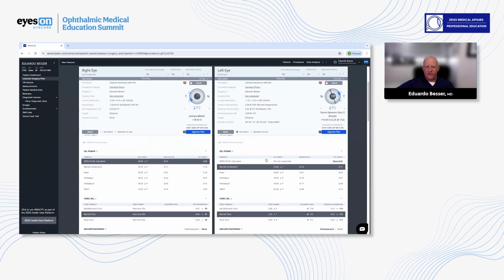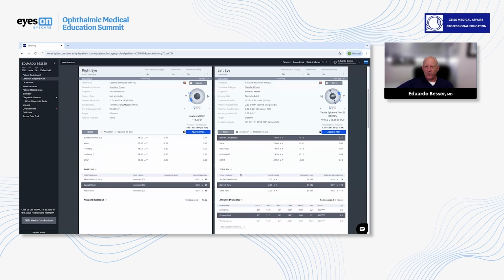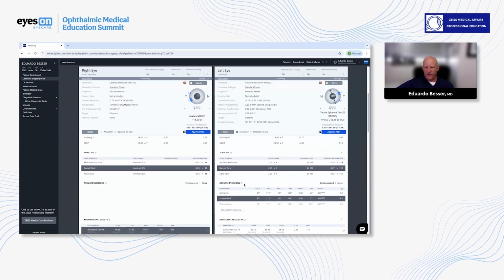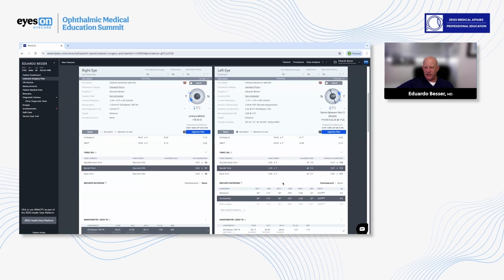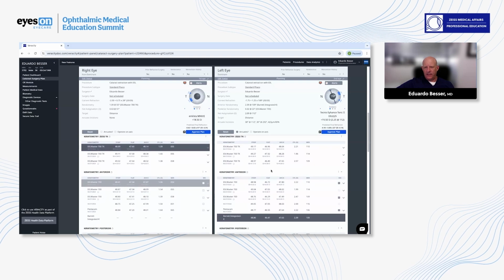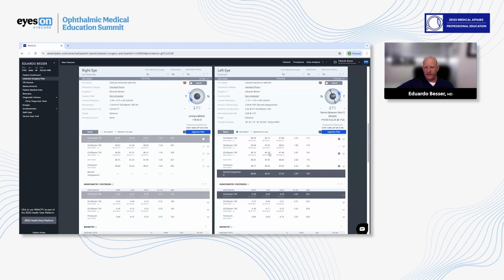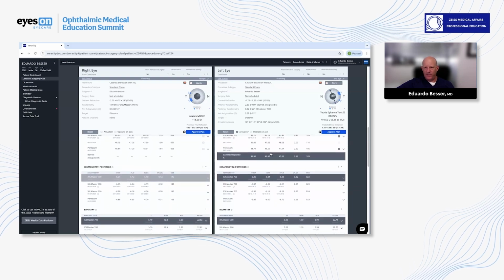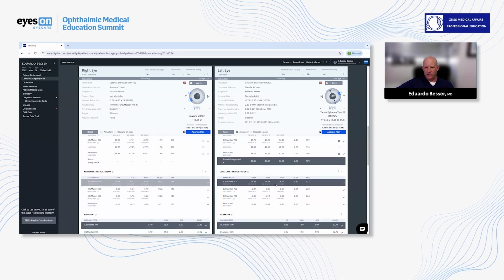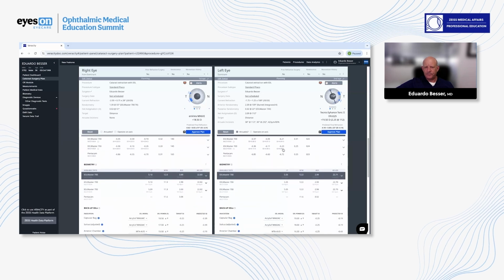As we saw, the spherical equivalent calculations, here are your formulas. For the toric calculation, these are the formulas which are live. And for your arcuate incisions, here are your formulas. And so you can see all of this and where it comes from. Here are the measurements that were seen prior, but they don't show whether there's a variation. It doesn't give you that alert. And so these highlighted ones are the ones that are going into the calculation of your intraocular lens.